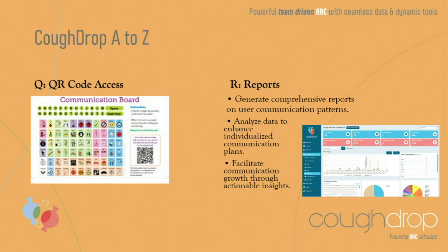One example of how I would use this would be the core versus fringe, right? Typically you want to see an 80-20 split, so you want to be more in the core, less in the fringe. But what happens to all of our new AAC communicators? Our fringe is probably closer to that 80%. Our core is this much. So what is it that we're hitting? Well, if I come over and look, I'm going to guess it's nouns.